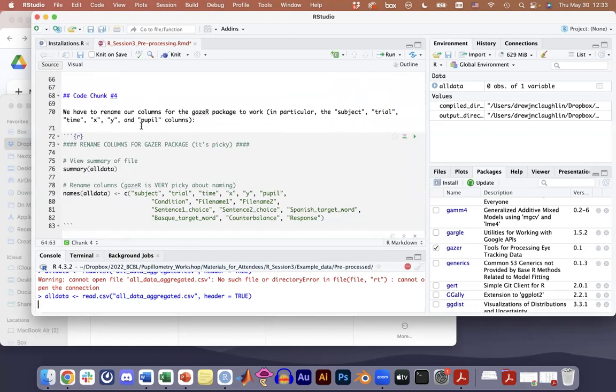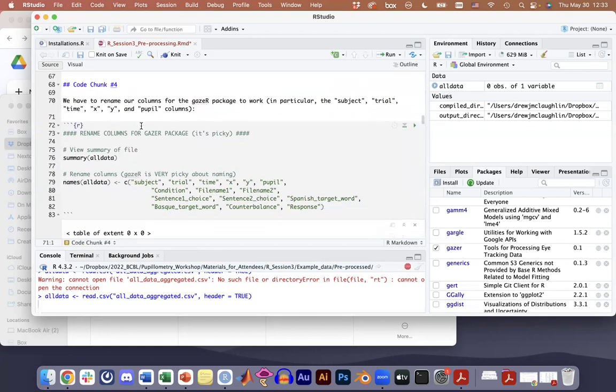Sorry, I don't actually work in R Markdown very often, so I think R Markdown doesn't like the way I do my directories, just as a note. Okay, are people able to load the all data? Okay. This is funny because, in classic fashion, this worked for me when I tested yesterday, but now it's not, because I'm in front of a group of 40 people. I'm sweating bullets up here.